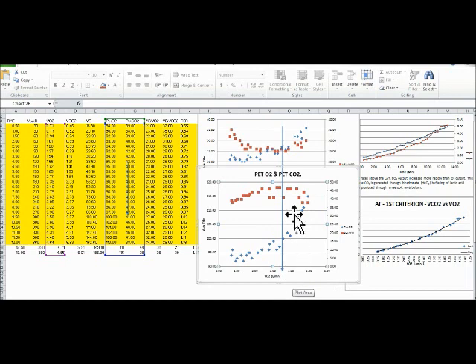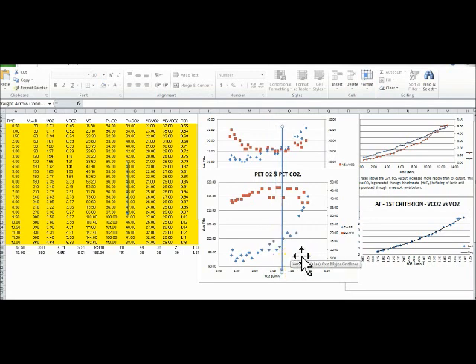That's at about 3.5. Okay, let's move it over a little bit, see what we get. It's pretty consistent right there. So I think I'm going to stick with about 3.5 right here. So you see how it changed from 4 to 3.5 when we looked at the two together. We saw, okay, fairly consistent here, and then it really starts to spike up. You can use those two values on top of each other. That'll help you out a little bit.